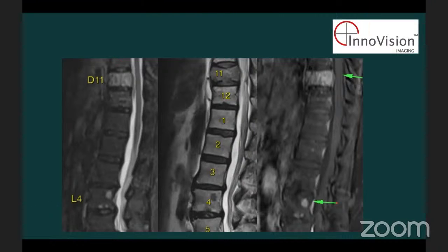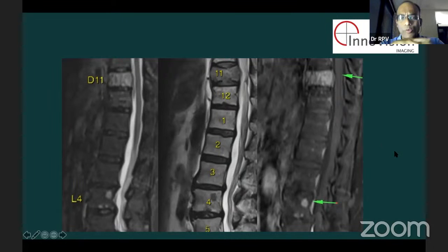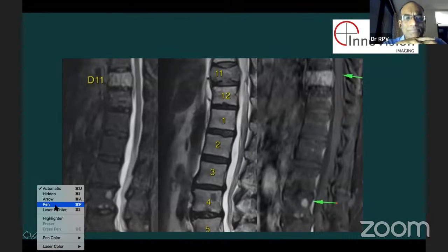Yeah, okay, right. So just so you know, this is a STIR image, this is a T2 image, and this is a post-contrast image. So Harshit, can you go ahead? Now we want to start discussing surgery. The first set of them were all non-surgical, so you were not greatly excited. So tell us.